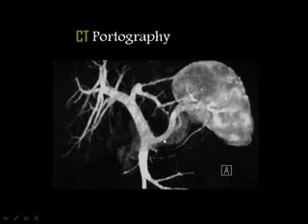And this is an examination which can be done recently by CT scan. It is known as CT portography. You just inject the contrast material intravenous and order the CT to obtain images for the portal circulation. Then you can see this is the spleen, this is the splenic vein, and this is the superior mesenteric vein, this is the portal vein, and these are the portal venous radicals.